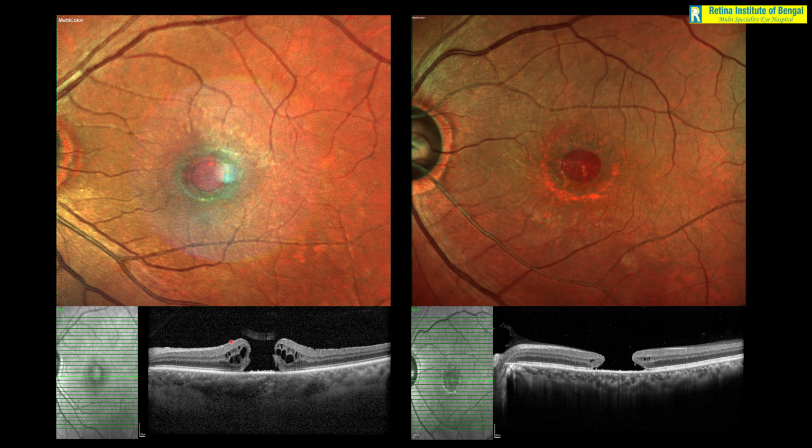Now of course we know by looking at the OCT we can answer that question, and I have shared that in a previous video on macular holes. But say if you do not even look at the OCT, if you just look at the multicolor image, even then you can easily make out which of these two macular holes is likely to do better. That means likely to gain more vision post-op.